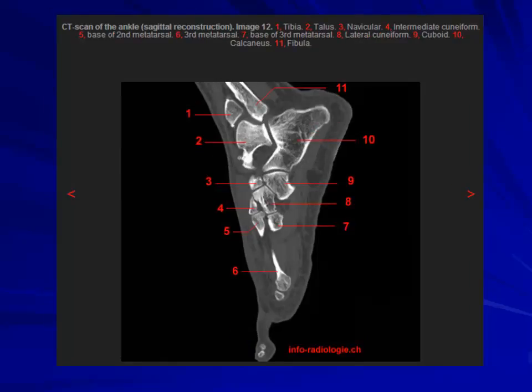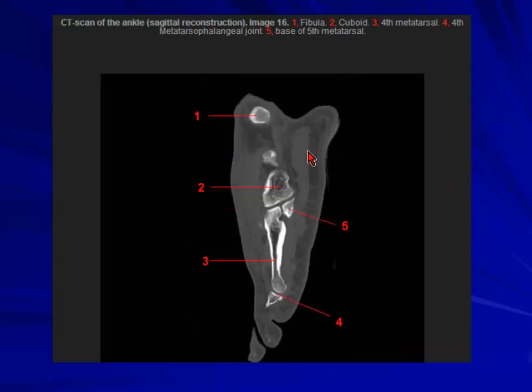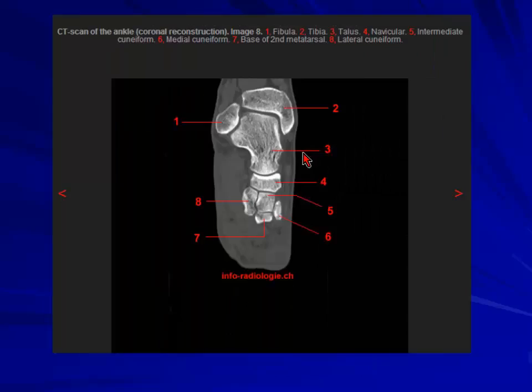Again, similar appearance, but more defined bones coming up as you go along, slice by slice. And this is basically calcaneus articulating with the cuboid. So coronals, again similar. You just need to identify these bones.